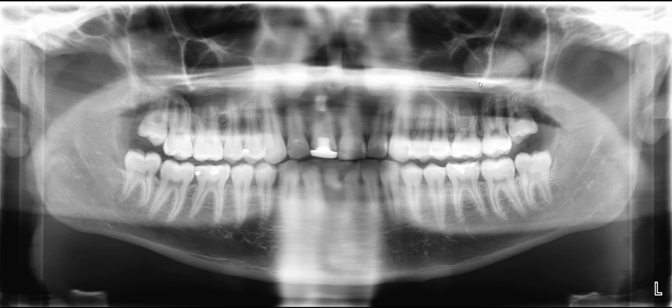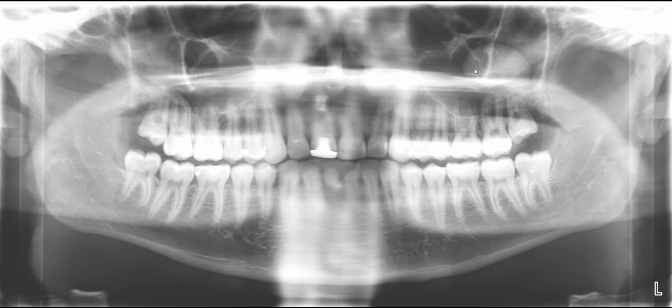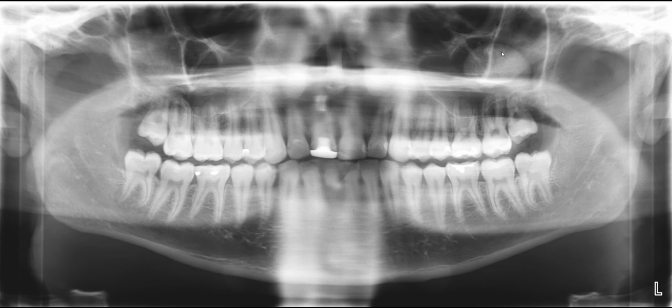One way to determine that is to compare it to bony tissue or soft tissues, such as this. What is this one? Before I give you the answer, what does this opacity represent? And we can see it on the contralateral side as well. That's an earlobe, right? A portion of an ear. And to me, this overall density is much closer to soft tissue.